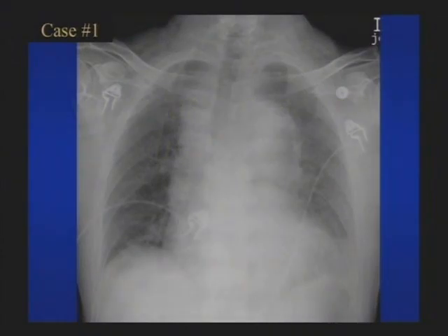And I think this is a history of trauma, but even if it wasn't a history of trauma, it'd be nice to have a generalized differential for this finding. And again, as I said before, a lot of chest radiology is knowing the pattern in which to put it. If you get the right pattern, the differential is usually pretty straightforward. If you get the wrong pattern, you're totally in trouble. So what's the pattern, and then with that history of trauma, what's the general differential, and what are you going to think about as a cause for this abnormality?